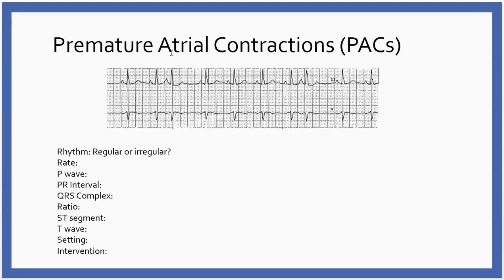All right, now I'm going to go back to these early beats because I've got to identify those. When I look at the early beats, the QRSs look about the same. Got a little ST segment depression there, got a little funky look at T wave, but I'm looking, where's my P wave? Notice something interesting. This is the P wave from the beat before, okay? So this would be P wave, this is QRS, and there should be a T wave here.